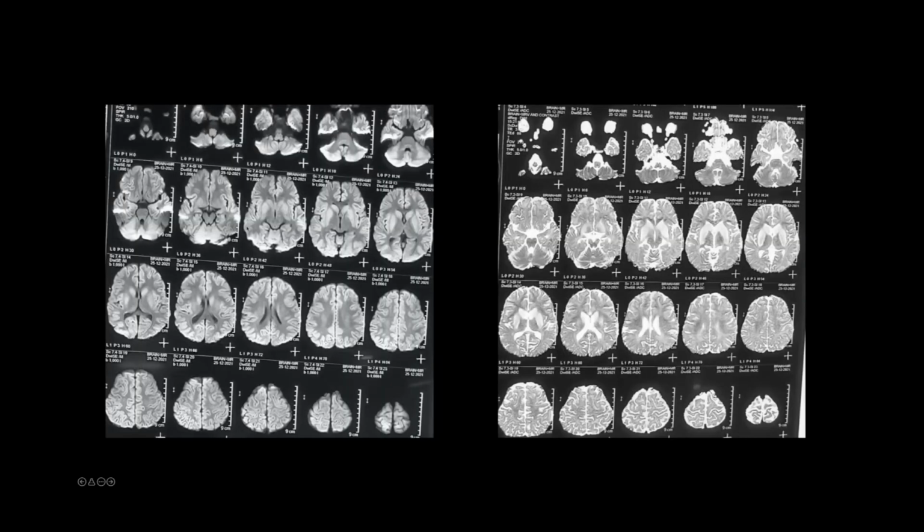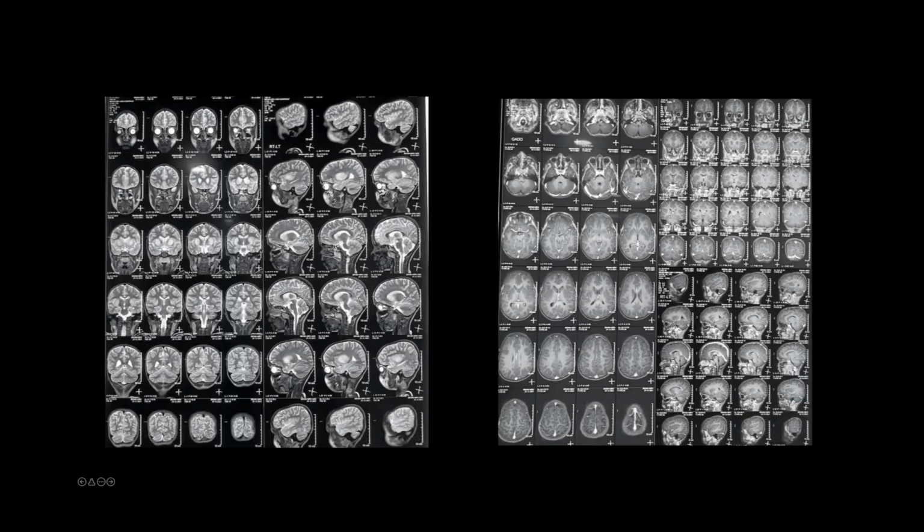On diffusion, there are some bright signals on the DWI, but they don't correspond with low signal on the ADC. So there's a facilitated or slightly mixed pattern of diffusion, but predominantly it is a slightly subacute stage or old stage. But there is edematous change in the dorsal striatum and some degree of volume loss in the cerebral and cerebellar hemispheres on both sides. On sagittal images, there's mild thinning of the corpus callosum, no signal abnormalities in the white matter. Post contrast images, no contrast enhancement.